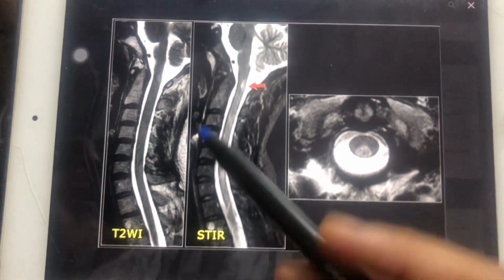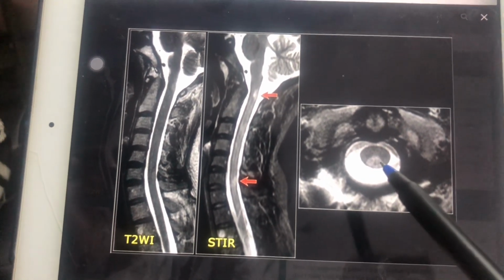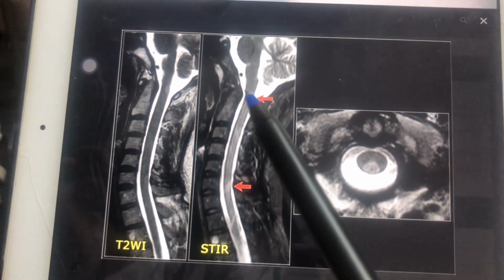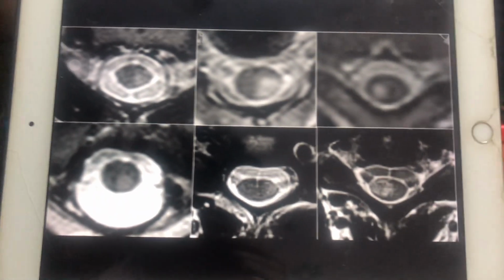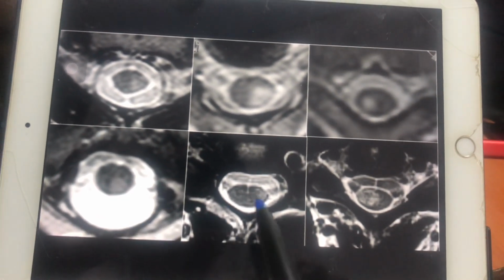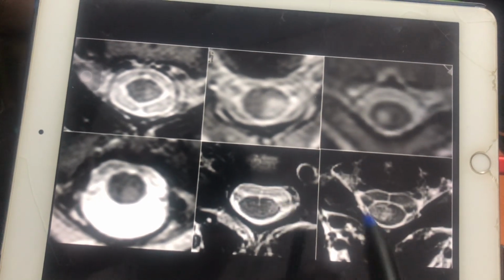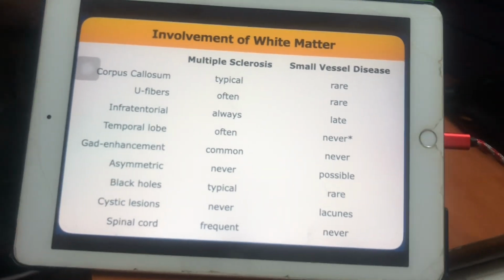So here is a typical case where the cervical cord is involved. Again, very small, dorsally located. Axial sections are very useful for any spinal pathology. So here you can see the dorsal cord being involved. It is wedge shaped, and again very small. It is involving only a portion of the C2 level. Okay. Again, this is the spectrum of spinal cord involvement in MS. Peripheral location, wedge shaped, small, right? Lateral involvement can also be there. Again, this is dorsal involvement, lateral, lateral, and again dorsal and lateral, dorsolateral here. Okay, so that was the type of location.